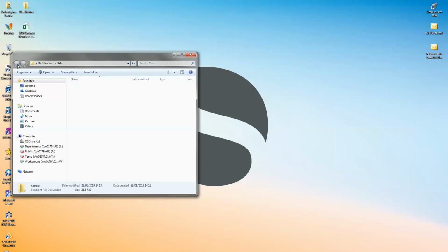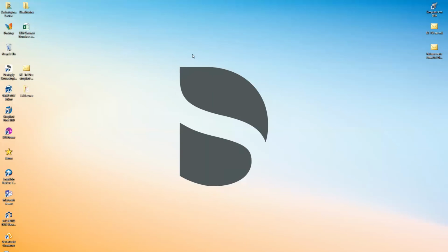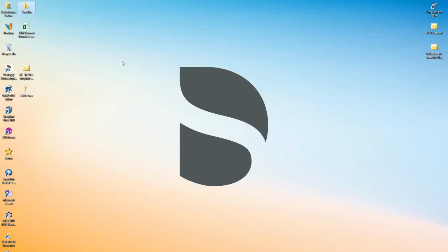Now, if you were to send it to someone, let's say a mentor, you're sharing a case or you're discussing cases with someone else for guidance, you would first need to rename this folder into something that you would remember. And then once you've renamed it, then you can compress the folder. So you click on right click and then click on Send To and compress zip folder.